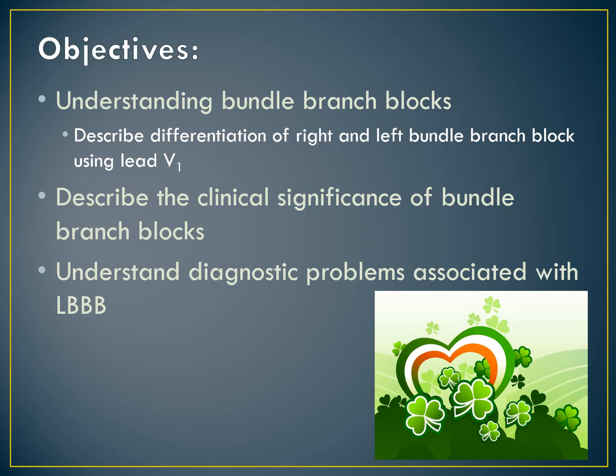In today's lecture, we are covering the following objectives. Understand what bundle branch blocks are, how to differentiate between a right and left bundle branch block using V1 of our 12-lead printout, describe the clinical significance of a bundle branch block, and the diagnostic problems associated with a left bundle branch block.